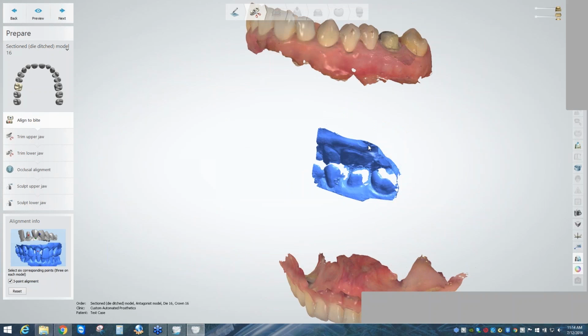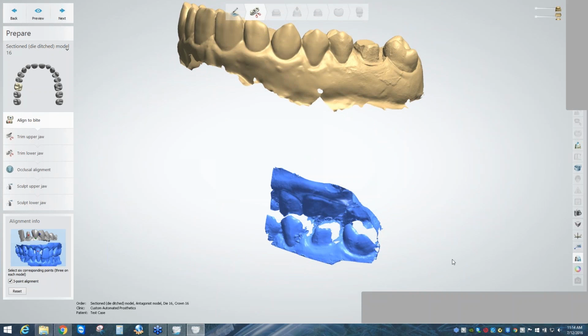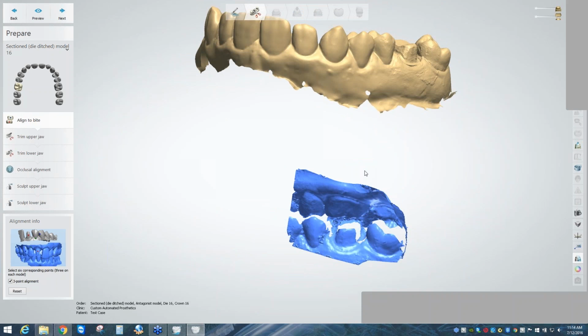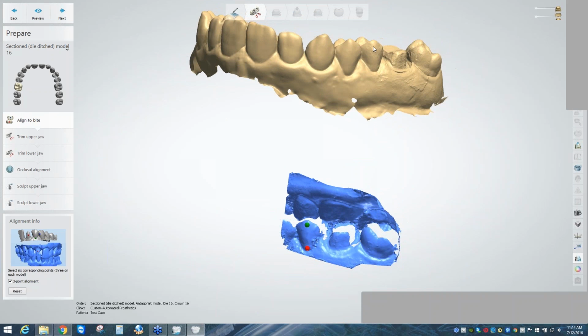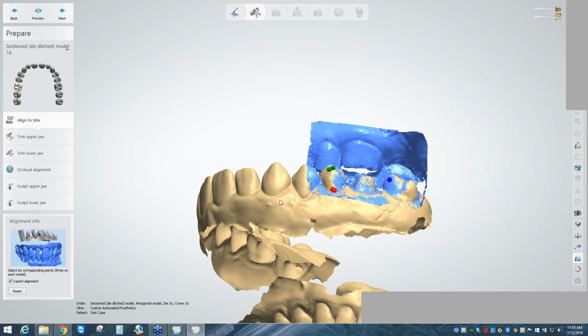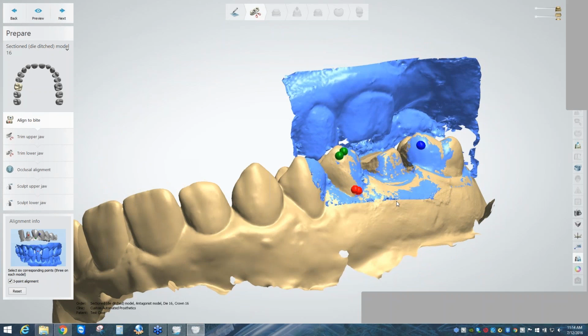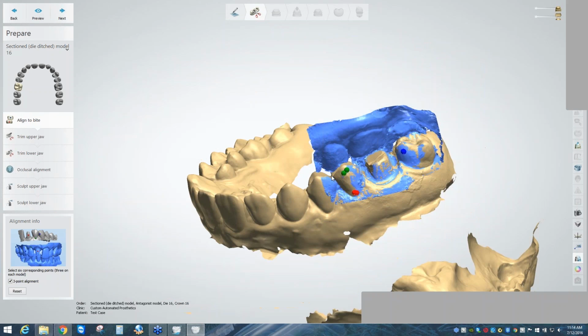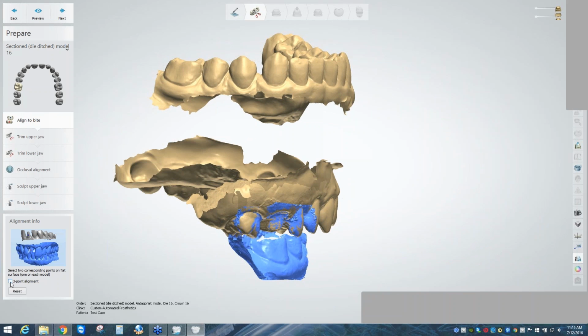One other thing that sometimes helps is I like to turn off the texture scans a little bit because it helps with actually seeing the shape of the model. So let's preview again. There we go. It's much better. So now that, like any alignment in 3Shape, now that we see that the colors are shifting back and forth, that should be aligned. So I'll go next and move on to the other arch. So let's see. So I'll switch to 3-point alignment again.